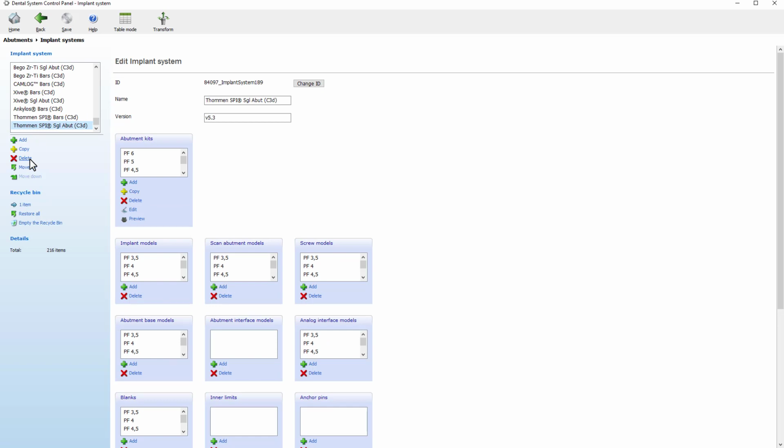Remember to save all the changes and make sure the Empty Recycle Bin box is checked before pressing Yes, so that all deleted files will also be removed from the bin.